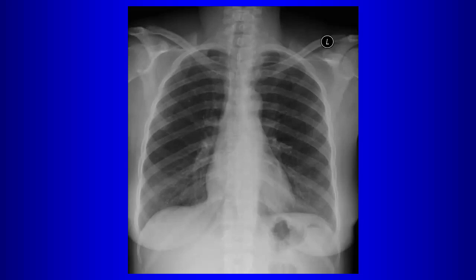What else is on your checklist on the chest radiograph? Lung parenchyma, pneumothorax, pneumoperitoneum, consolidations, right? All of that. But what have I not mentioned so far? Visualized portions of the abdomen. Yeah, those are okay. Anything else? Effusions, pneumo. Yeah, those are okay. How about the airway?